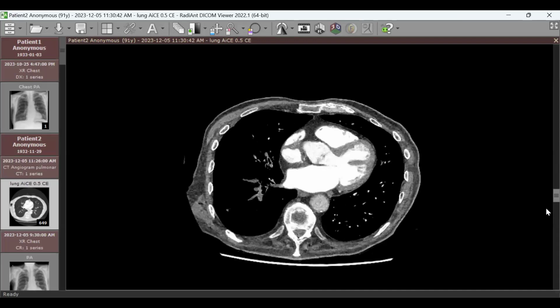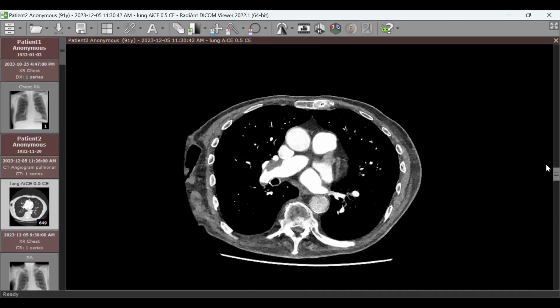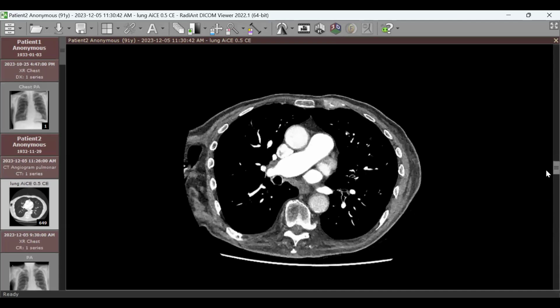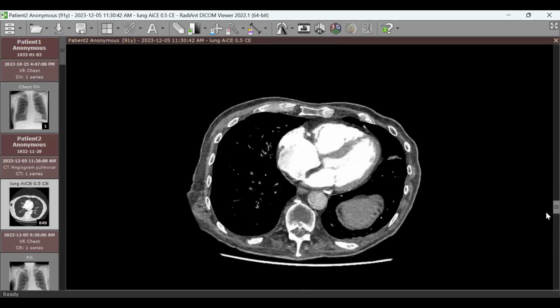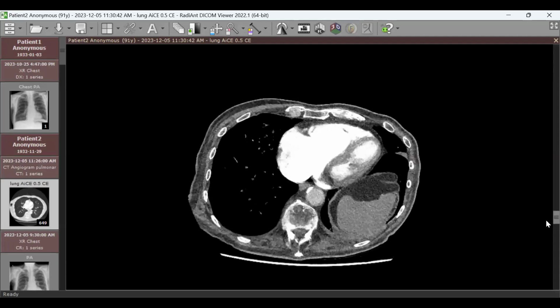And with the size of the embolus, do we expect to find any right heart strain? Yeah, actually, we have to go back and measure the main pulmonary artery and aorta. So it's more than one. So I expect pulmonary hypertension. Good. And if we measure, that's clear, right? So again, more than one, the ratio is, so I expect heart strain is present here. Other sign here?